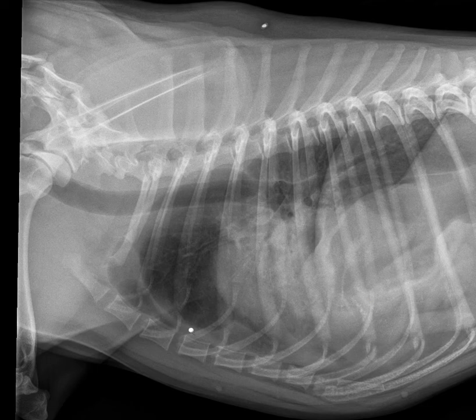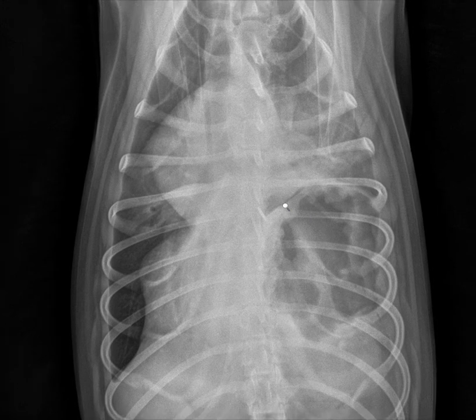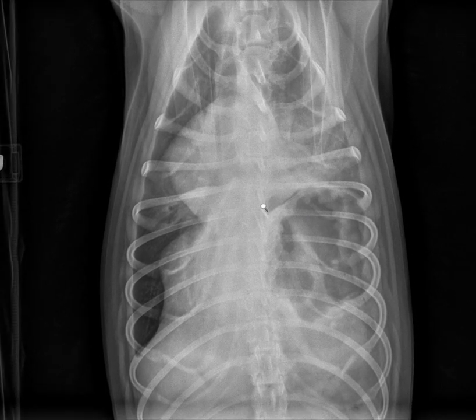There's a little bit of evidence as we're looking at the pleural space of pleural fluid characterized by mildly increased opacity in this region, reduced conspicuity of the ventral cardiac margin, and on the VD view, there's a few thin pleural fissure lines. I would also then, especially in a patient that was hit by a car and has this type of pathology, take the time to assess each and every one of the ribs and vertebrae on both views.